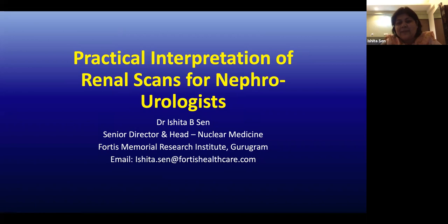Once again, I'm here to discuss with you some practical interpretations of renal scans, especially the diuretic renal scans, the DMSA scans, and the transplant evaluations. Most of my presentation is images, so just sit back. These are the kind of images which you may get as spotters during your exam. Also in your practice, you should know how to interpret and look at the renal scans. That's the whole aim: a practical interpretation of renal scans for nephrologists.